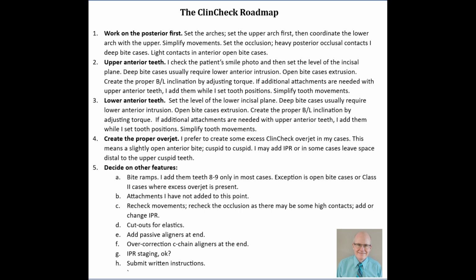I also check and adjust tooth movements. I simplify them. I try to make the movements as low as possible, especially movements that change the position of the root apices of the teeth. Then I set the occlusion. In deep bite cases, I'll usually go for heavy posterior occlusal contacts. In anterior open bite cases, I'll usually want light posterior contacts.